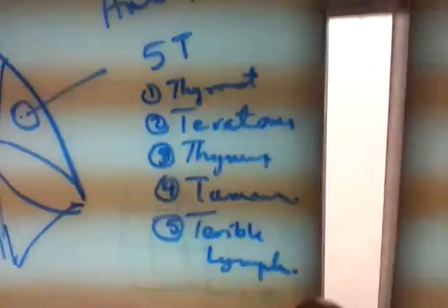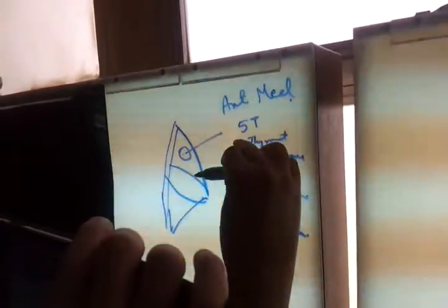Terrible means serious. Okay? If this mass in the anterior mediastinum is starting from the sternum till the heart.